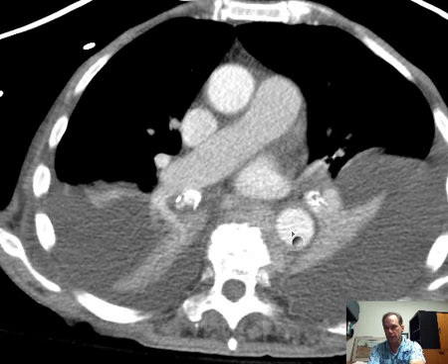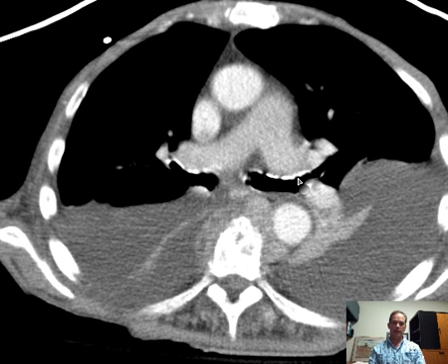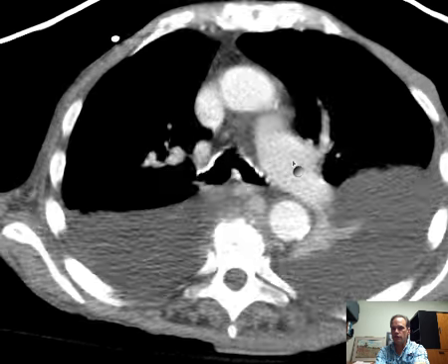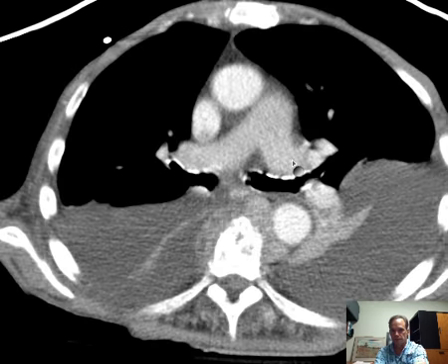And I distinguish the main pulmonary artery in that phraseology because it's important to distinguish it from the right and left main pulmonary arteries. And it's very important in anatomy and in radiologic reporting that your nomenclature be absolutely clear and leaves no question as to specifically what anatomic structure to which you are referring.